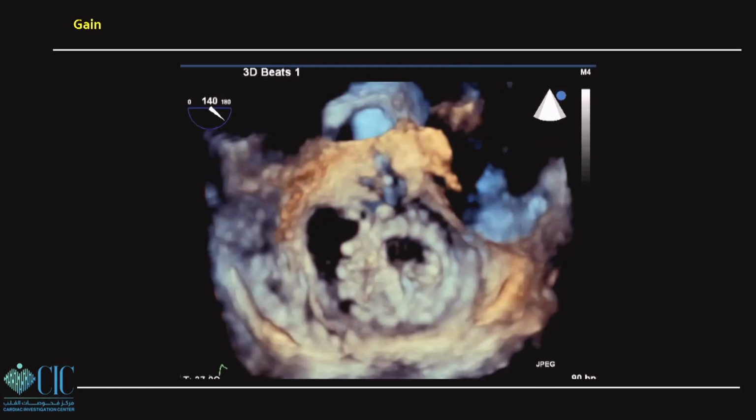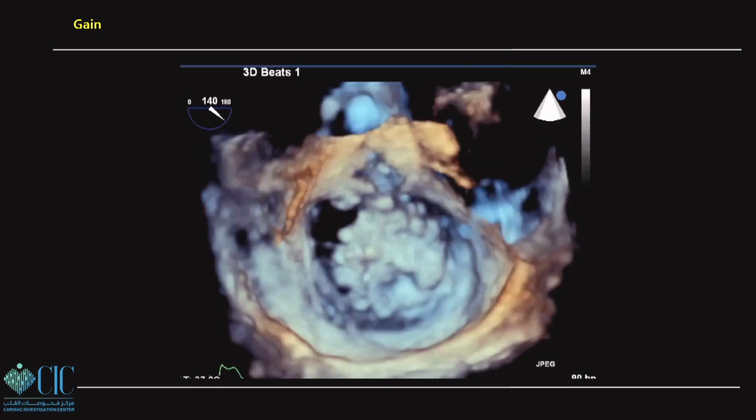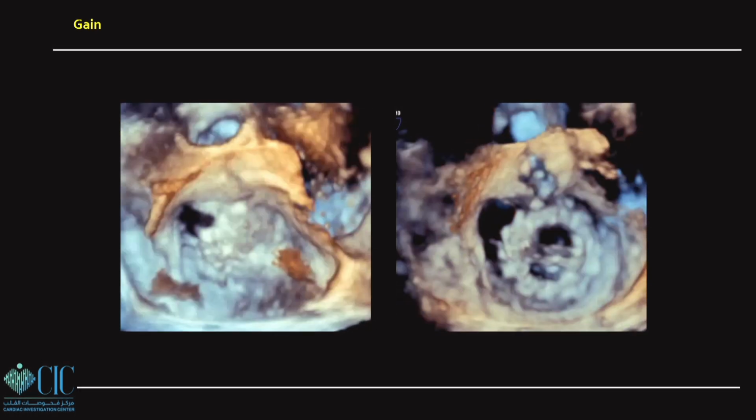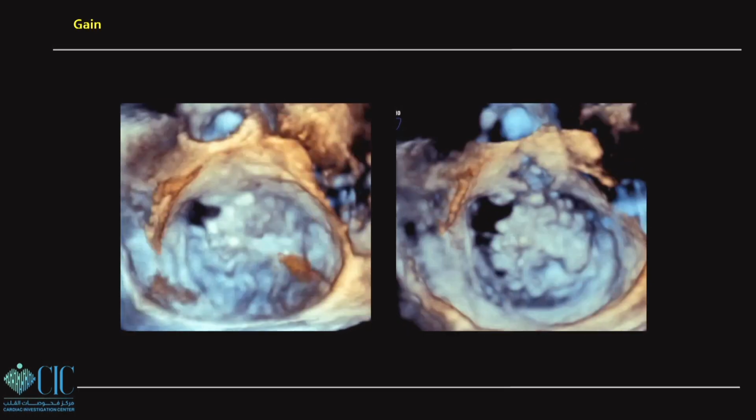Huge, right? So the valve, I'm not sure why the valve is not working, although all this defect is there. But I cheated you for the next time, but this is the last time I will trick you. This is the exact same patient. Okay, what did I do here? The gain. Yeah, I decreased the gain down.